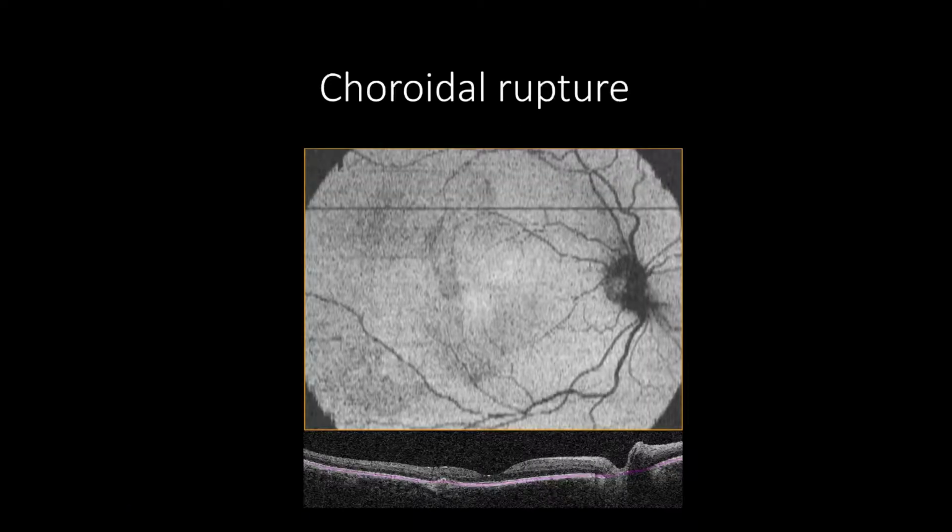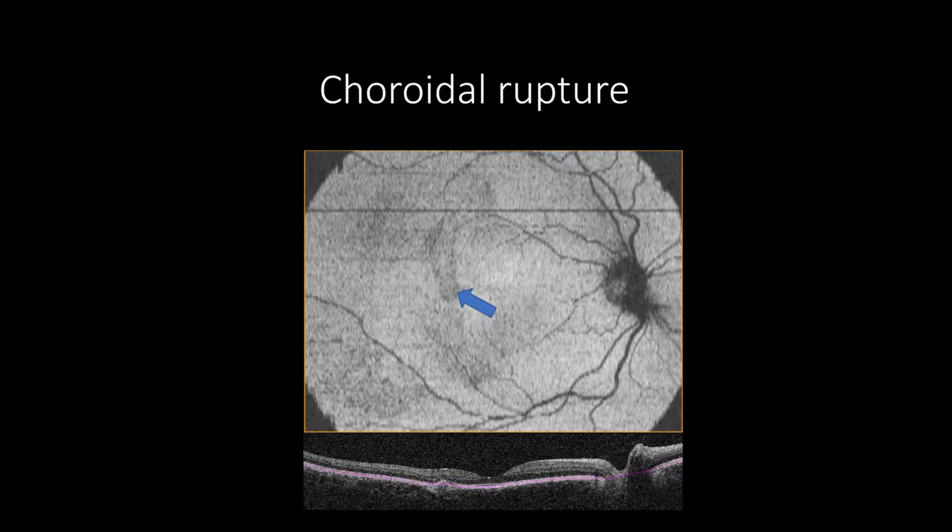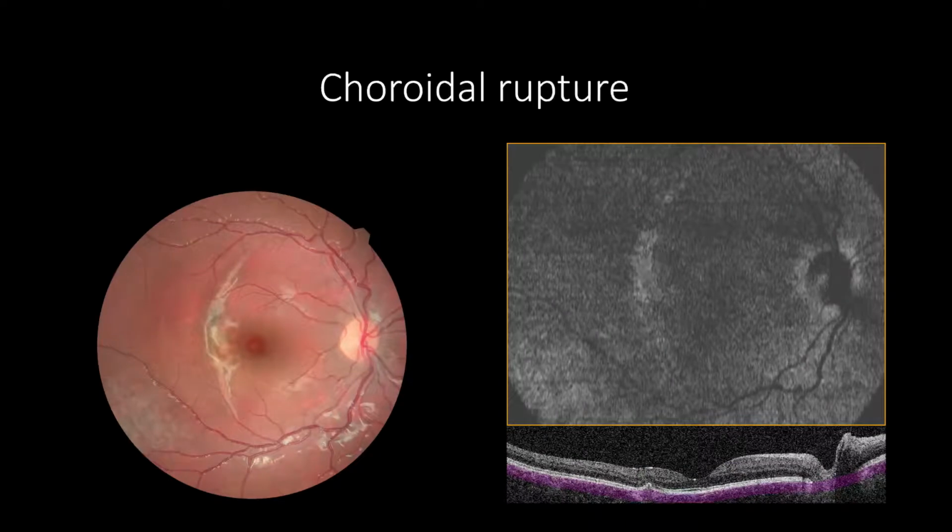In cases of choroidal rupture, the RPE slab will show choroidal rupture in slightly hyperreflective borders corresponding to the area of RPE protrusion. The choroidal slab will show the choroidal rupture as an area of increased reflectivity in crescentic shape parallel to the optic nerve or ora serrata.